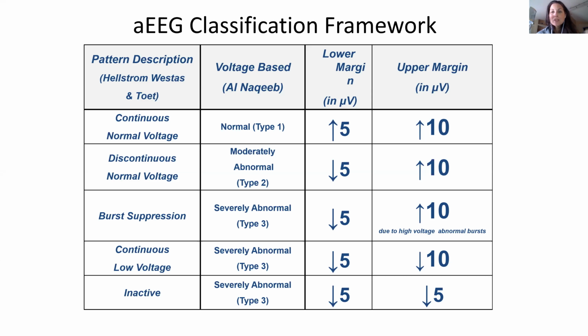When we talk about discontinuous, that's really where we're looking at that lower margin, and it's spending the majority of its time lower than 5. I spent some time last month in Germany with Katrin Klebermass and Monica Olischar, and they really are continuing to advocate for, especially our preterm babies, using what's high and low discontinuous.